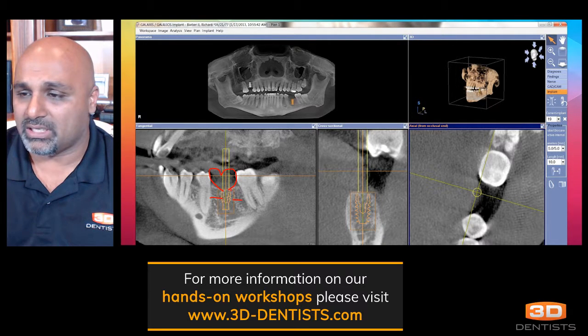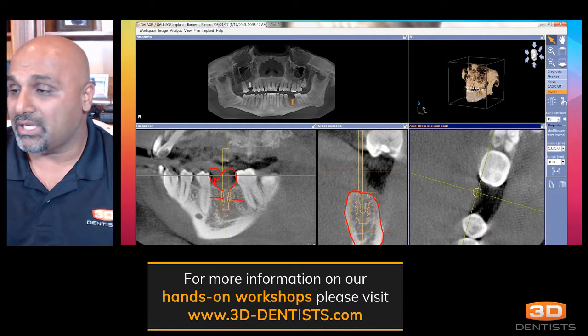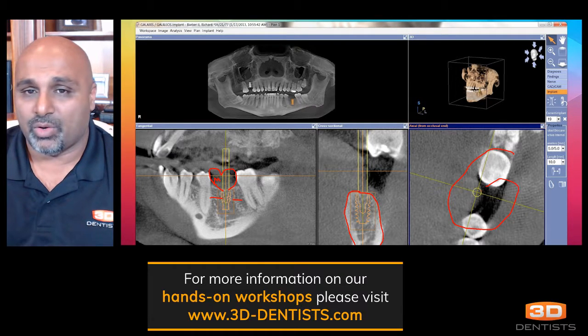We can certainly see that right here the mesial is bigger than the distal. And then when we look over here in terms of amount of bone that we have, we can see that the implant is well centered. But the truth is, this is 3D, not 2D, and we have to take a look over here.